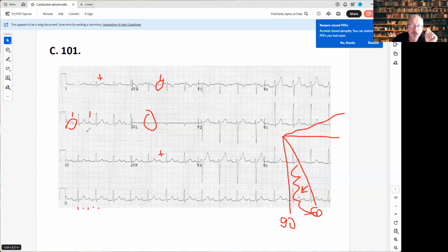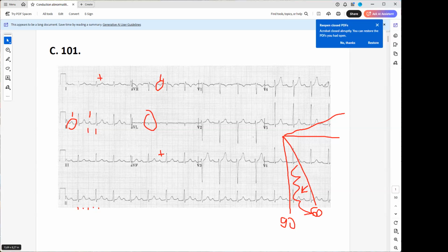Next one that you have to look at, but we haven't touched yet, but you should know, is the morphology of the P wave. That's normal. So the P should be less than 0.1 second and not taller than 2.5 millimeters. So that's okay. That's a sinus rhythm. Now you can talk about the PR distance because this is rhythmic, meaning that every P is followed by QRS. Now you can talk about blocks.